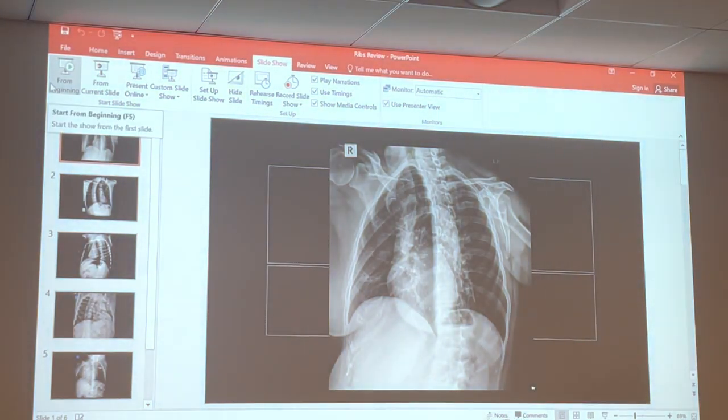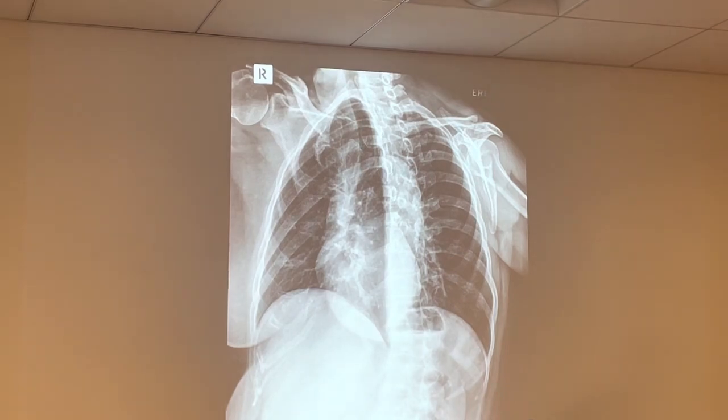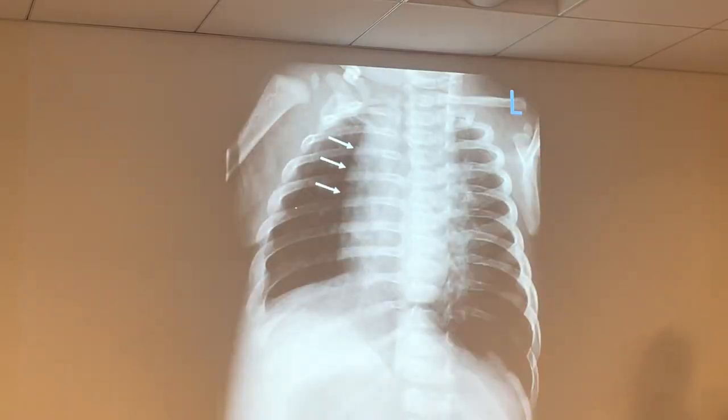One more time. Start over. The last one, I couldn't tell that the right side is elongated. Look at them in comparison. Look how much longer this is. Look at how much more C-shaped this is. You can talk about the rotation too. Now, this does not have full rotation. They did not do quite 45 degrees, which is probably why it's throwing you off. But look closely. Look how much longer, look how much shorter. Okay, I see it now.